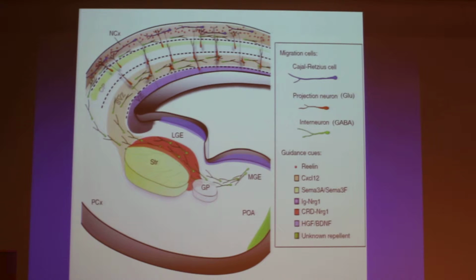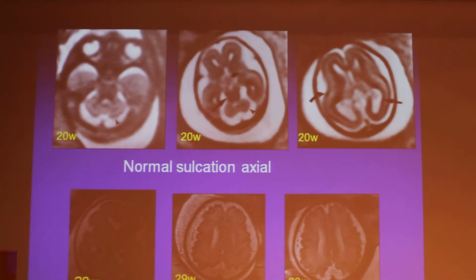And I think our job as radiologists, and this would be true if you're doing prenatal or postnatal imaging in malformations of the cortex, is just to describe it as nicely as we can and try to not necessarily name it. If we describe the cortex correctly, then I believe that we'll be able to help the various geneticists work out the different malformations.